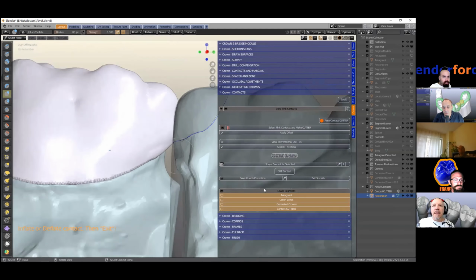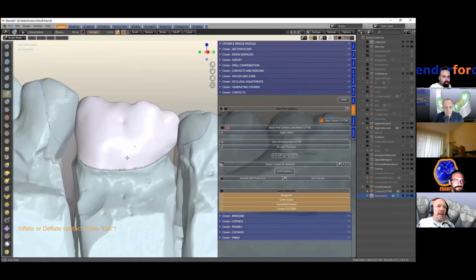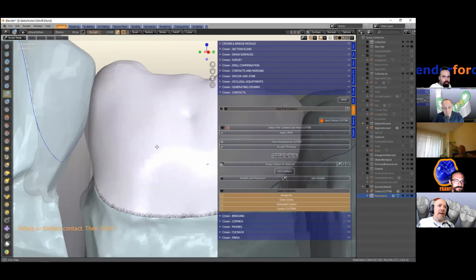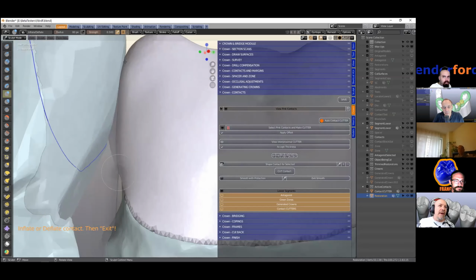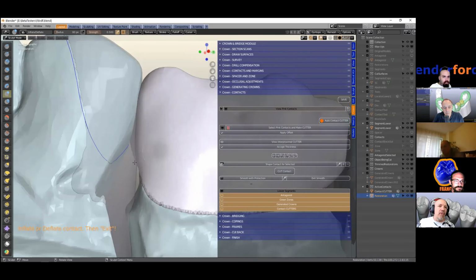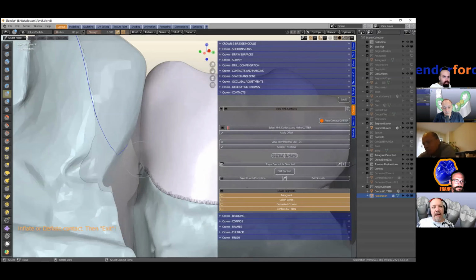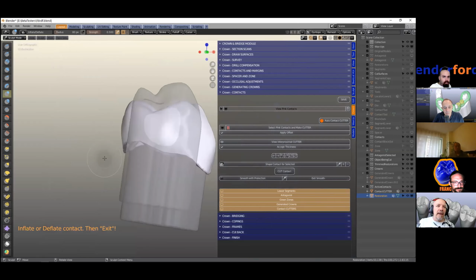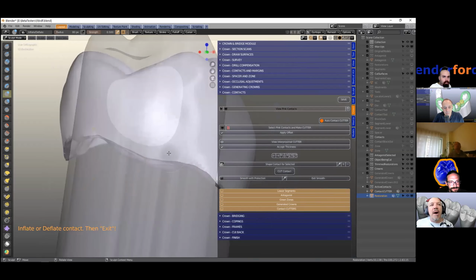Okay, so let's have a look at the other side. Of course, we've got a hell of an undercut tooth, and it's going to cut all the way to the bottom here, because the cutter is there. But let's view it anyway. So we've got it over here. If it goes too close to the margin, please note that you're going to cut off your margin. So we can minus this if we want to.